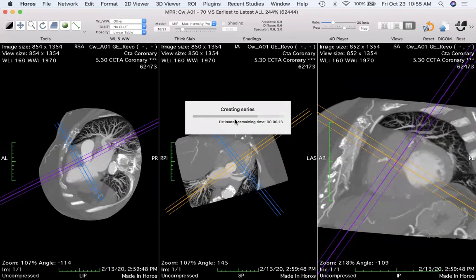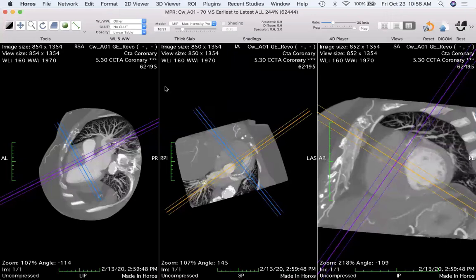So I guess it's taking a bit of time to compute this because of the maximum intensity projection. Usually it just does this in about 2 seconds. So, okay, so that's that. Anything else on these?